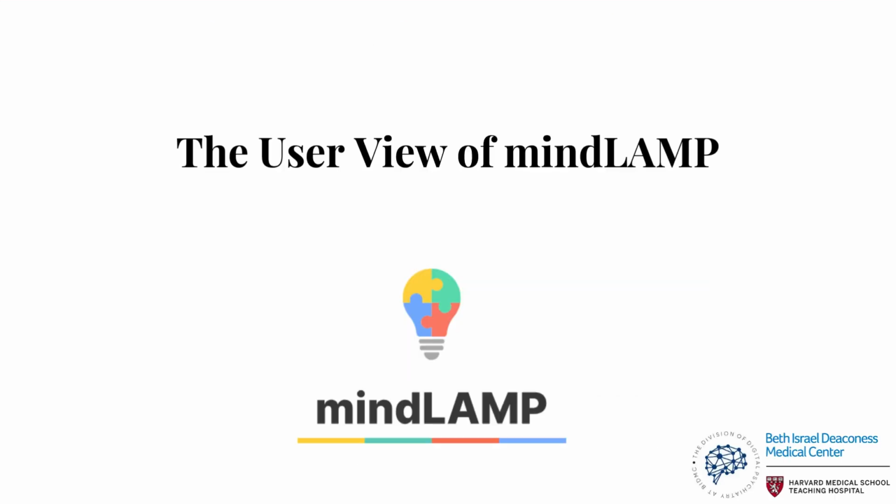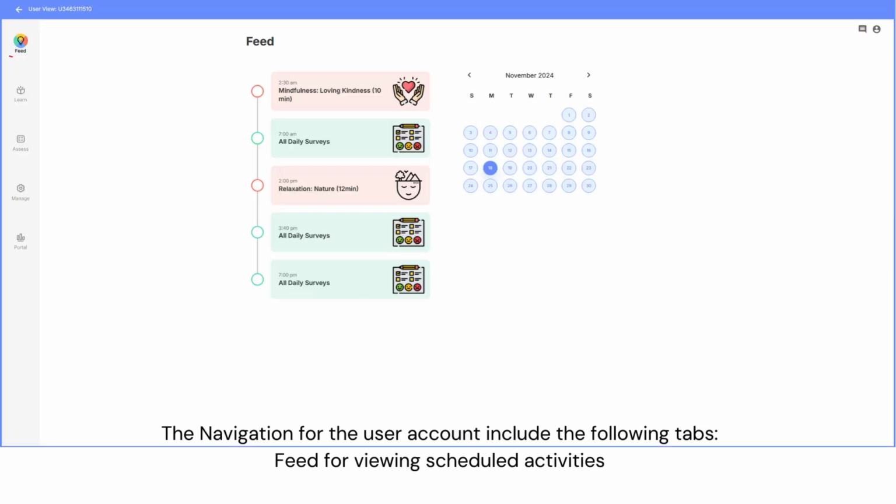In this next section of this tour, we will take a look at the user view of mindLAMP. This will cover the patient navigation tabs: Feed, Learn, Assess, Manage, and Portal. Feed is used for viewing scheduled activities.